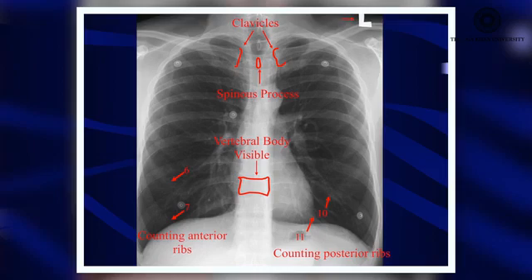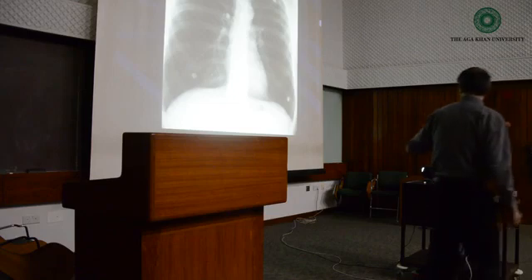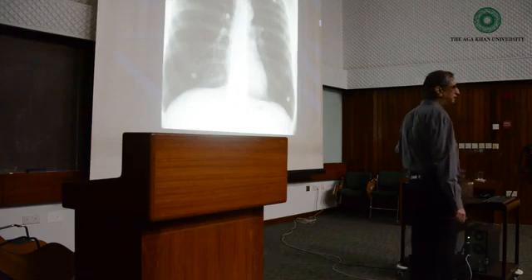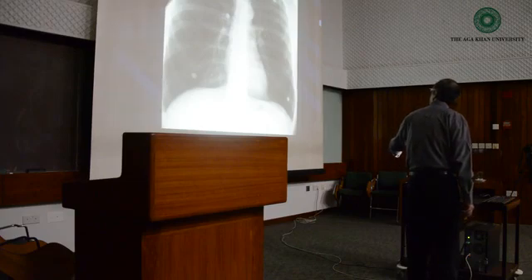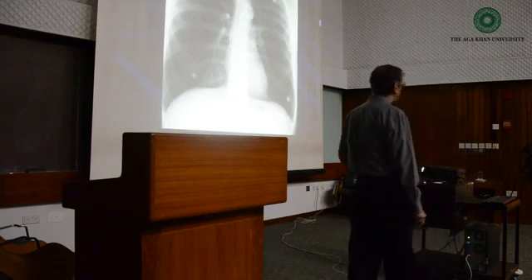But if the person rotates a little bit, that clavicle would go away from the midline. For example, this would be ending up here. So wouldn't this distance be more? That would be rotation to the left, and with rotation to the left, the heart would shift to the left even more. And if there's rotation to the right, then this clavicle wouldn't end here, it would be ending somewhere here. So wouldn't this distance be more? That would be rotation to the right.